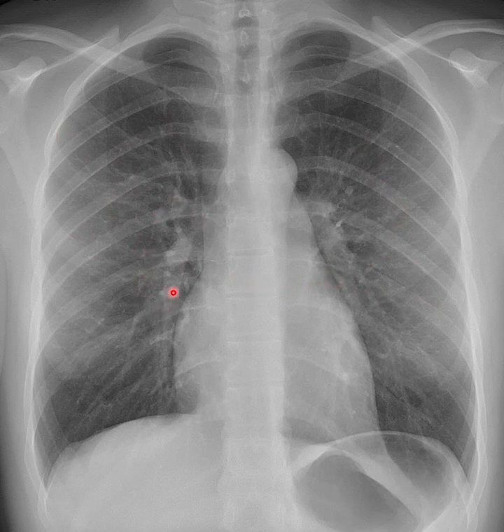In this area here, where it's a little bit more opaque, laterally on the lateral borders of the heart here, we call this the hilar region or the hilum. This is where the great vessels enter and exit the heart. So we also look to see the hilar region laterally from the heart there.